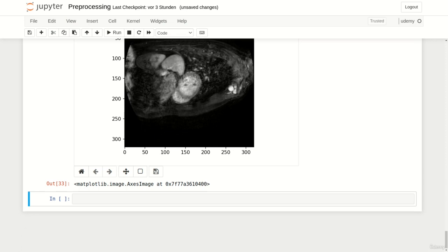If not already done, I highly recommend to take a look at the provided Jupyter notebook, because it contains some more detailed explanations and also an excursion about the reorientation of three-dimensional volumes. In the next lecture series, we will combine everything we have learned so far with a convolutional neural network to detect pneumonia in X-ray images. Alright, now we're really getting started.